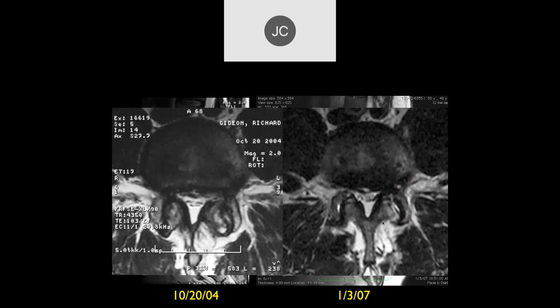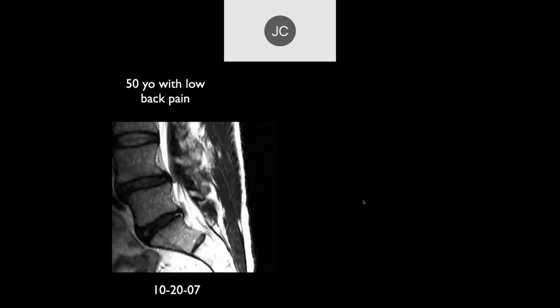And looking at a lot of high intensity zones in patients where you have prior studies, there is a little bit of central stenosis here. Most commonly these lesions are stable for years and they don't really change appreciably. So this is the norm, not the exception. But we've seen them develop, like we just saw. I've also seen them go away over time as well. So all things can happen.